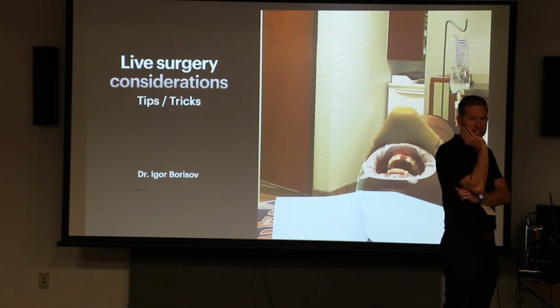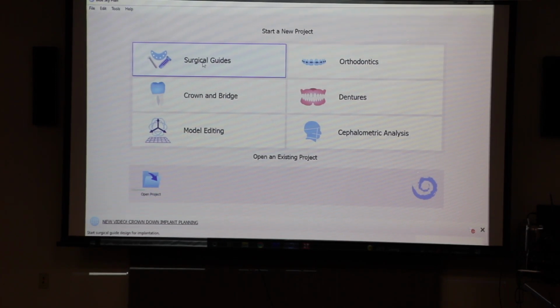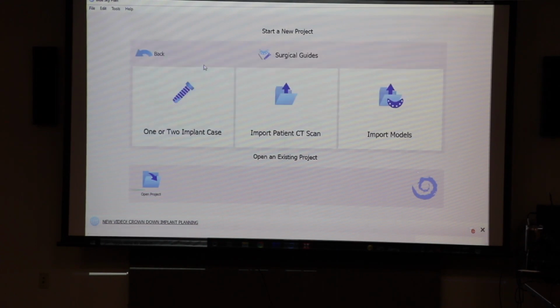I kind of wanted to just get maybe a quick brief overview on the software and then repeat it again after lunch, so that those that need a little bit extra repetition will be able to do it. So I click and I go into surgical guides. This gives me some options here.